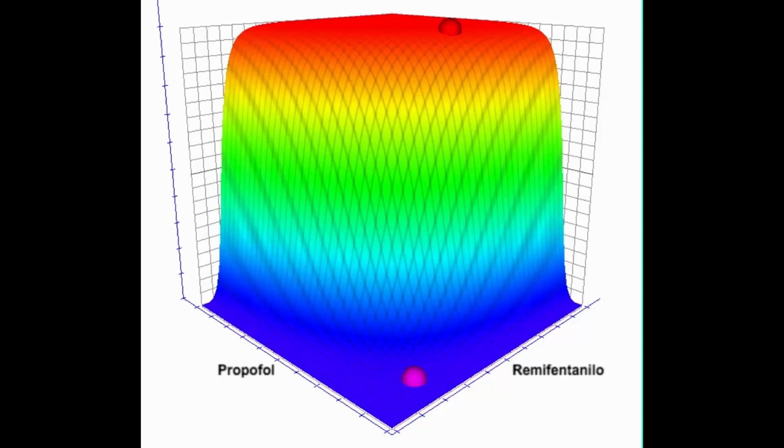TACAN 3D is the first 3D software that incorporates the surface model and allows its interface to handle the concept of space as a function of time, allowing to modify the PNR and the time to reach said PNR. For TACAN 3D, the PNR is the objective to be achieved in a stipulated time, and this PNR will be modified according to the variables of hypnosis, pain, and the adjuvant drugs administered. TACAN 3D is the first software that allows visualizing in which spectrum of the surface model the patient is navigating.